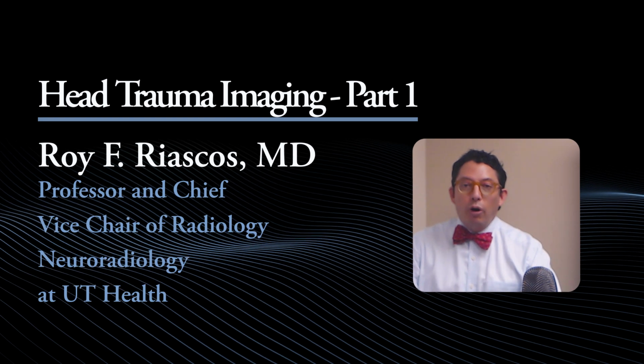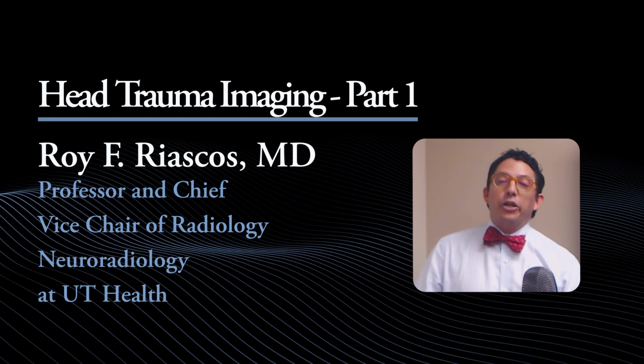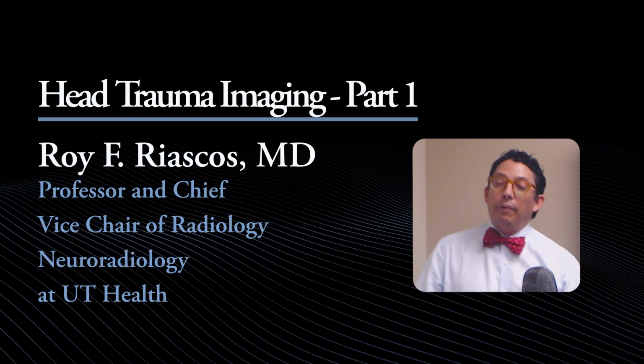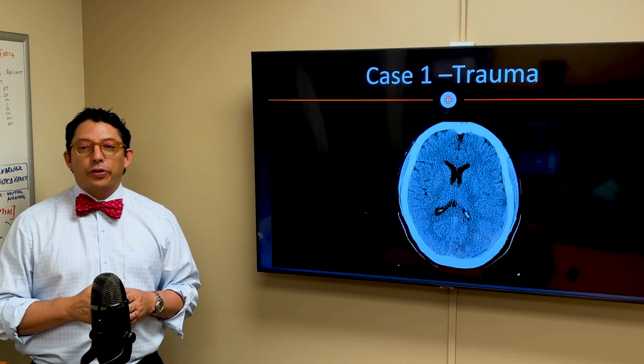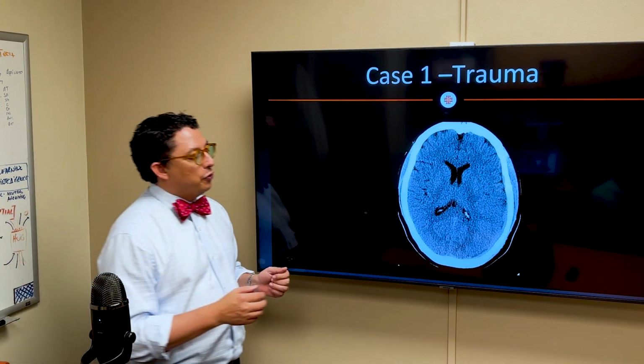Welcome to part one of the lecture on CT of trauma. So, after the introduction, now we're going to start with cases. And this is the first case. And this is a CT of the first case.